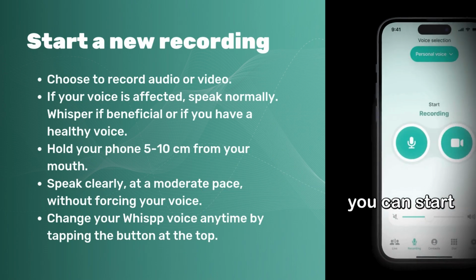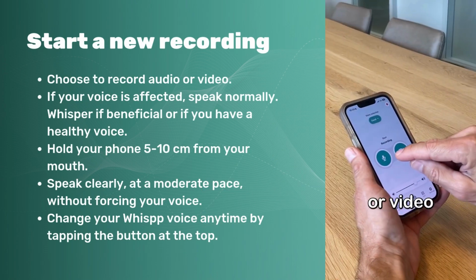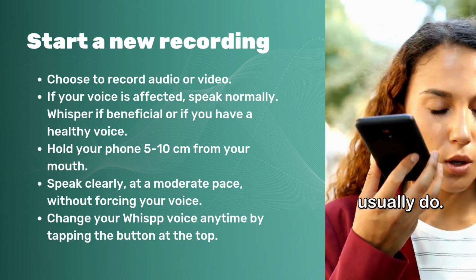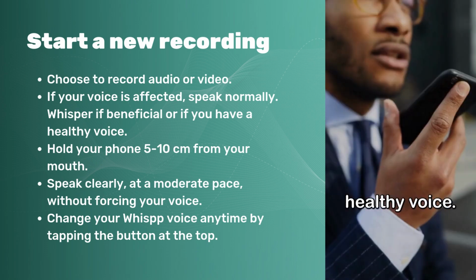In this screen, you can start a new recording. You can choose to record audio or video messages. When you have an affected voice, speak like you usually do. Whisper when it's beneficial for you, or when you have a healthy voice.